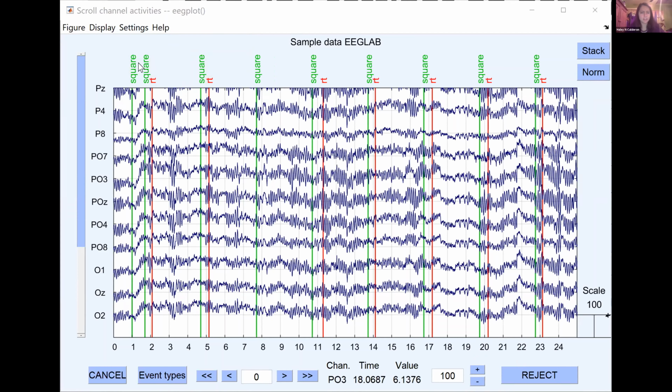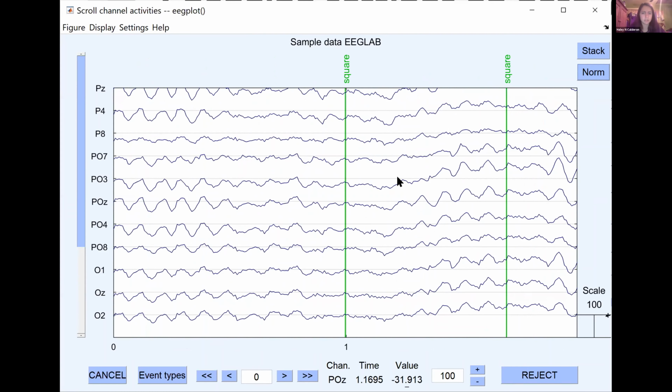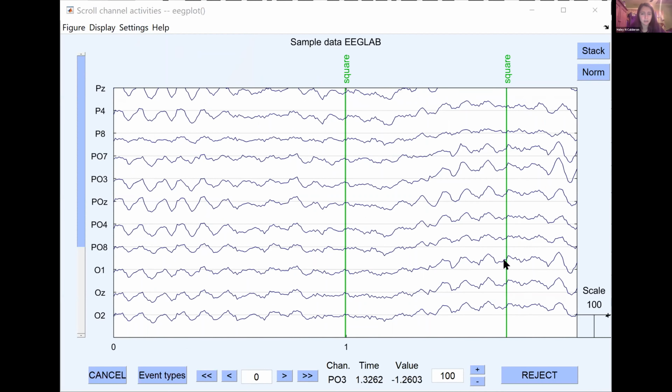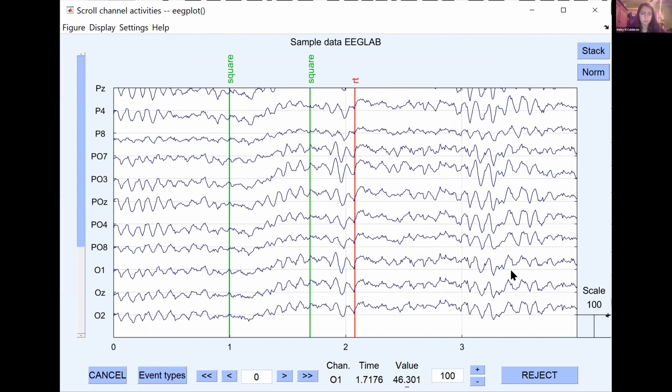reduce it down to, I think the lowest I've gone is 2 seconds. I think it gives a pretty decent picture. That might be too low depending on what you're trying to get out of the data. Maybe 4 would be fine. But when you have a clear thing you want to do with this data, and probably not using the sample data, you can define that for yourself.